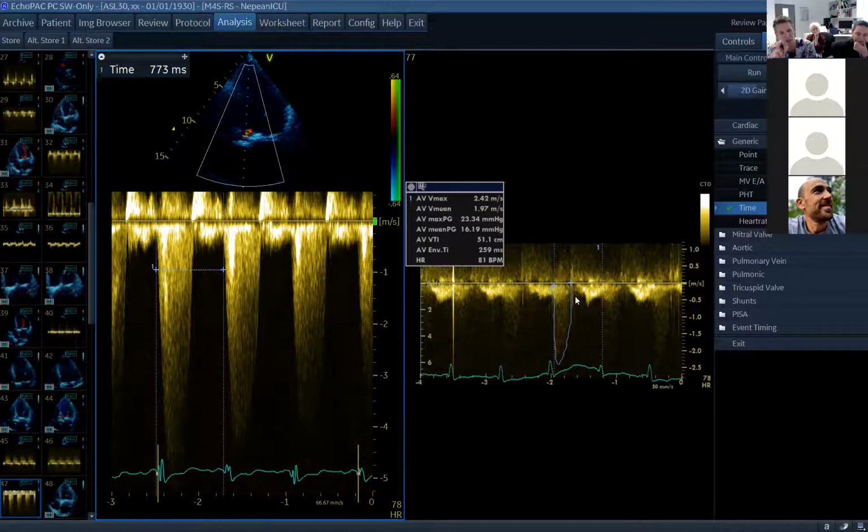I think the caveat is that the electrical wave activity sometimes doesn't exactly match up with the true beginning and end of systole, because the definition of beginning and end of systole is when the aortic valve actually opens or closes. So you can get a little bit of discrepancy, and they've shown that with strain stuff. Maybe we're getting into more research-based stuff here. The best way of doing it is comparing two next to each other and seeing how they compare. I think you just say whichever one starts first is going to be the mitral one. Try not to use the ECG as being absolutely true.